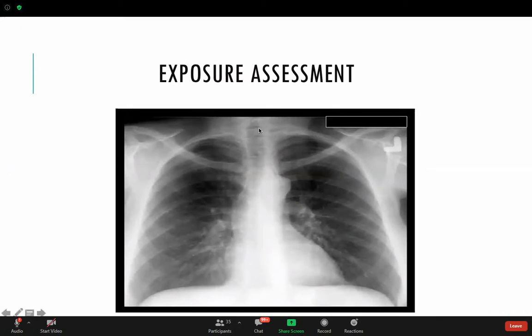Okay, guys, you see the spinal process here. You see these white dots over here. Is this clear, guys? You see here 1, 2, 3, 4, 5. So behind the cardiac silhouette, the heart, those spinal processes will disappear. They were there, but when you enter the cardiac silhouette, they disappear. That means this picture actually has a good X-ray exposure, okay?